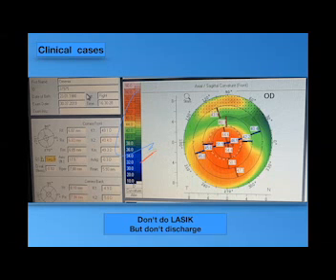Yeah, it's open for sharing. Dr. Hossam, yes. I will ask to check the other eye of the patient. Yes. And I will check clinically the best corrected visual acuity. And I will correlate the visual acuity of the patient with this topography. After this check and after checking the other eye, I will have two options, either to follow up the patient or to do cross-linking, but with correlation with the clinical data of the patient and the other eye.